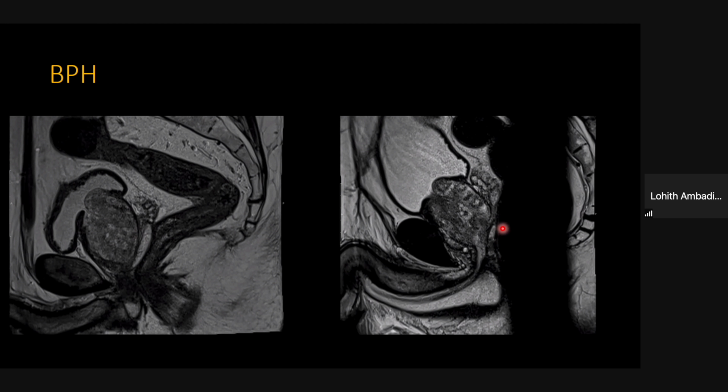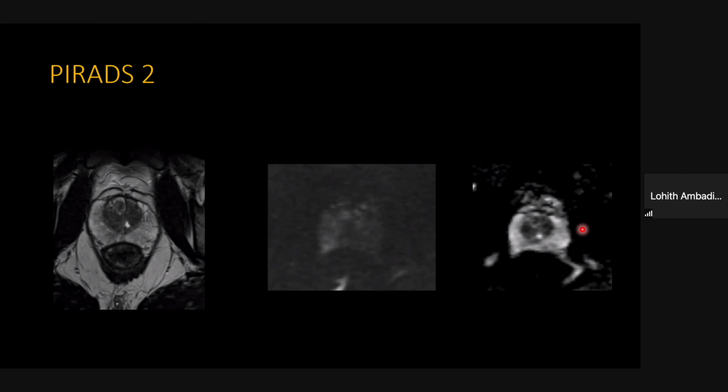Now, in this another BPH, you can see the ejaculatory duct very well, and this is the area of the verumontanum. You can appreciate the urethra, and you can provide measurements, the mid-urethral length, the membranous urethral length, which some studies have found that the length of the preserved length would indicate post-surgical continence, and so we can give you measurements on the MRI.